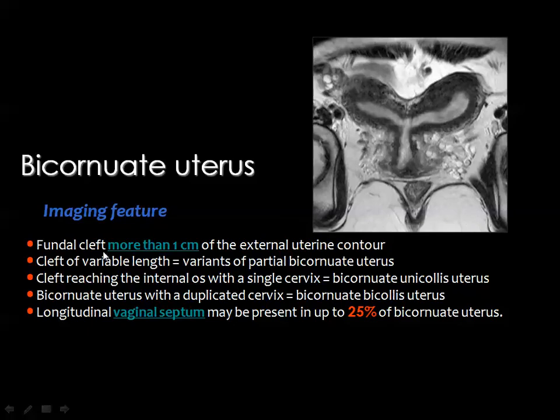There is a fundal cleft which is more than 1 centimeter from the external uterine contour. And you see, this is the body of the uterus. The body of the uterus on the right side, endometrial cavities, they are fused here into a single cervical canal.